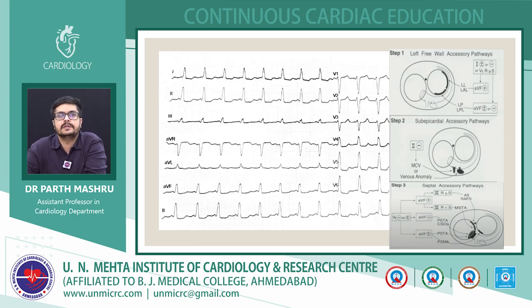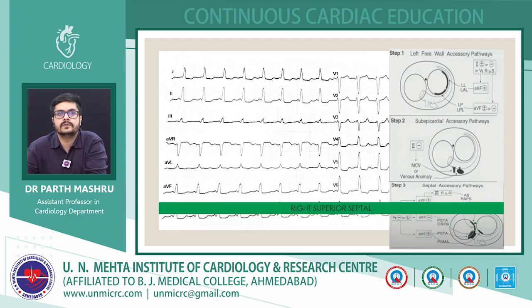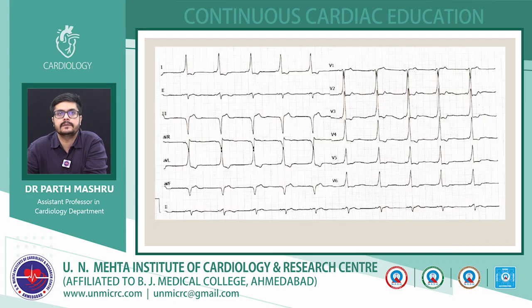So pre-procedural diagnosis of the ECG is very important, so that we know where exactly the pathway is and what are the risks of ablating, and you can counsel the patients and patient relatives better before the procedure about the possibility of developing AV nodal block during ablation. So this was a right superior septal pathway.